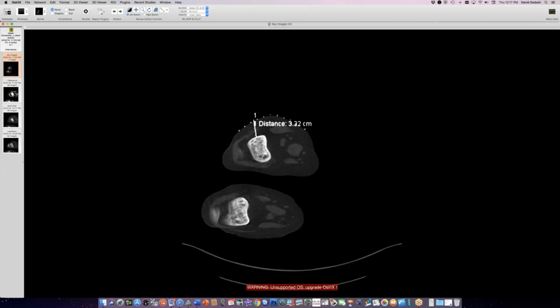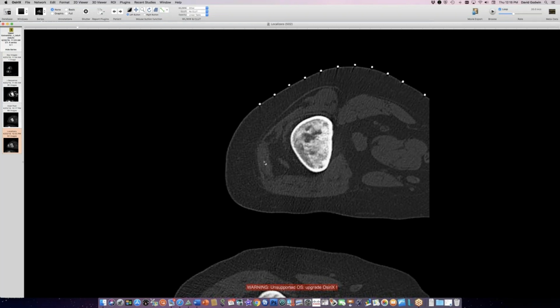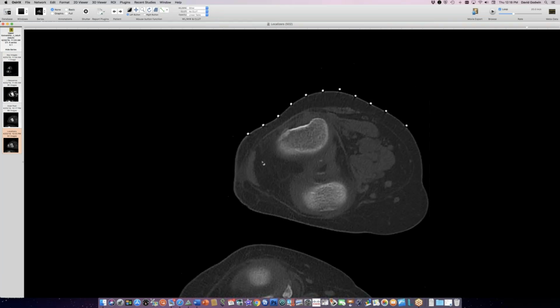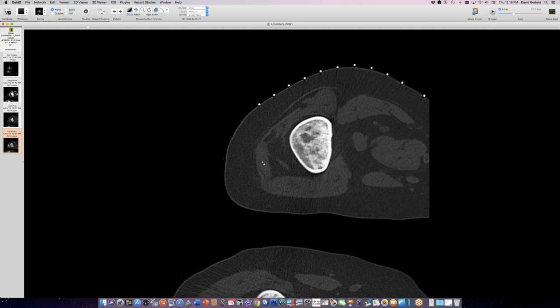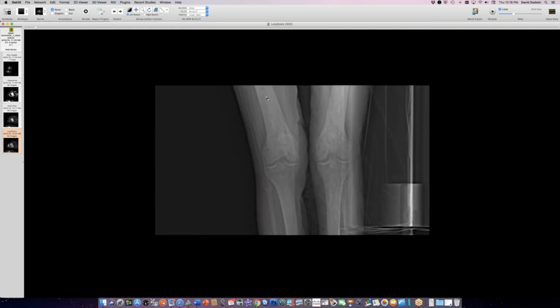I don't have any plain films of long bones, but let me show you from this localization thing here. There is this sclerosis of the bones, and there's a scout view here, I think, if I can find it. There it is. It just flipped by me. Let me see if I can find that scout view for you guys. I should have isolated. There we go. So on this scout view, you can see that there is this symmetrical sclerosis of bones.